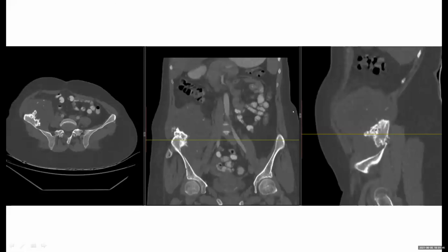Any other syndrome? Okay. So what are these calcifications in the lesion? These can be due to matrix of the lesion, like calcification scattered within the soft tissues. So it can be a chondroid origin.